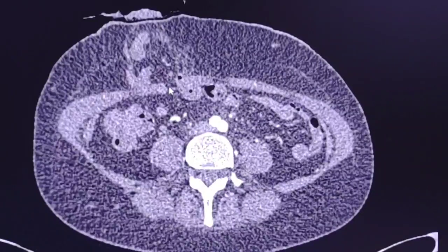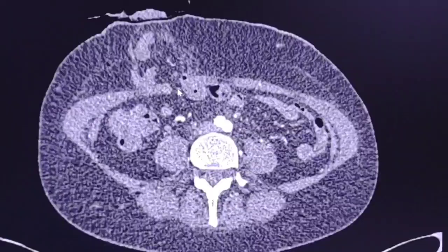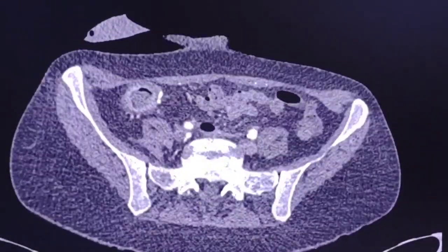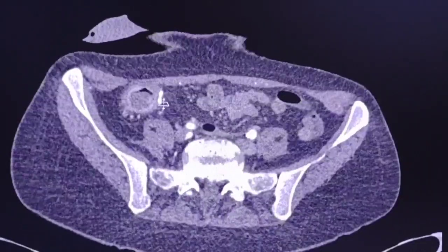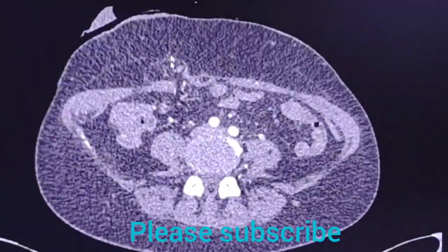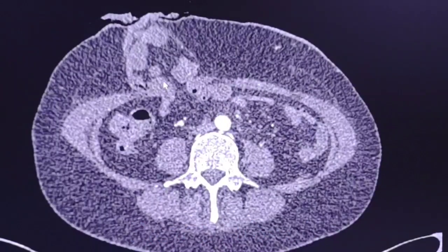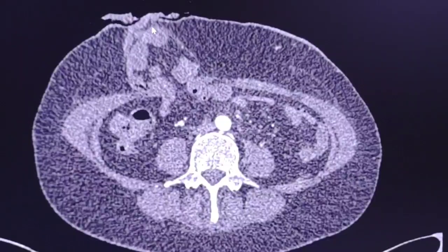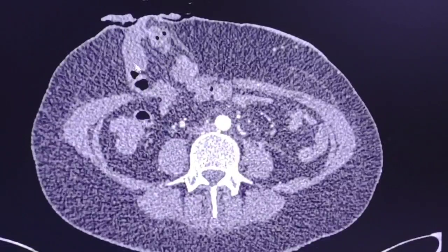postoperative changes. On the right side we can see a stoma here, and the reason is that at this point between the right colon and the distal ileum there is an anastomosis here, and let's go up. We can follow the small bowel which enters exactly to the stoma here, and there is a loop ileostomy at this point. Additionally, as you can see, there is a parastomal hernia which is uncomplicated.